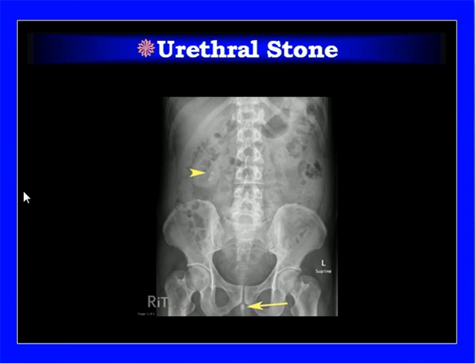The small arrow indicates the presence of the stone in the right kidney, but urethral stones are not very common, but still they are when they are passing through from the urinary bladder. At their exit, they sometimes get stuck in the urethra, proximal urethra or distal urethra, so they can be seen on plain X-rays.